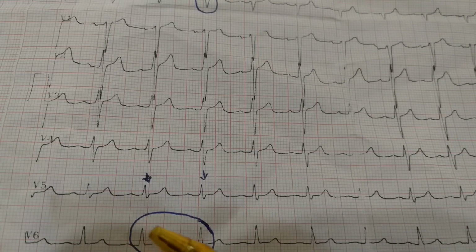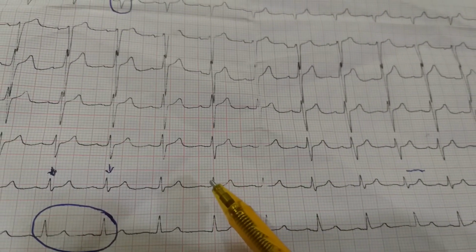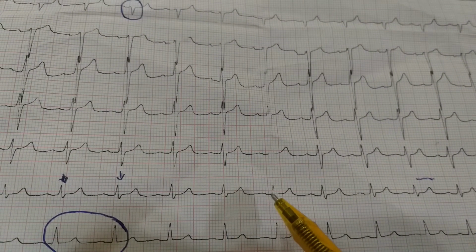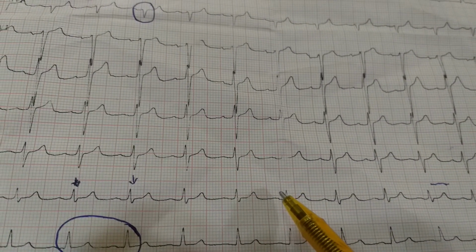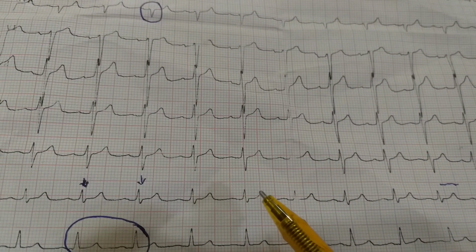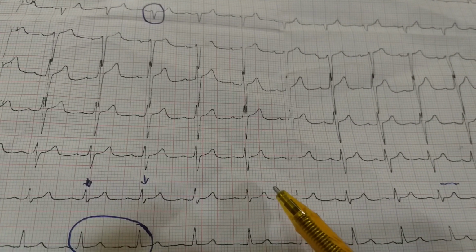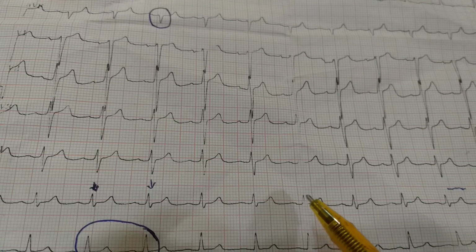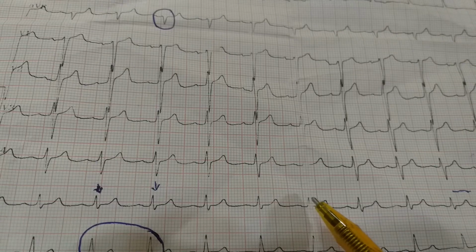We can also find an R wave which is right on top of a thick line. For example, we can take this R wave, and this is known as the reference R wave. There should be another R wave on the right side of this reference R wave, and it need not be on the heavy lines like this one. We apply the formula along the next R wave: 300, 150, 100. This is falling short of 100, so the heart rate is around 90 or 95.